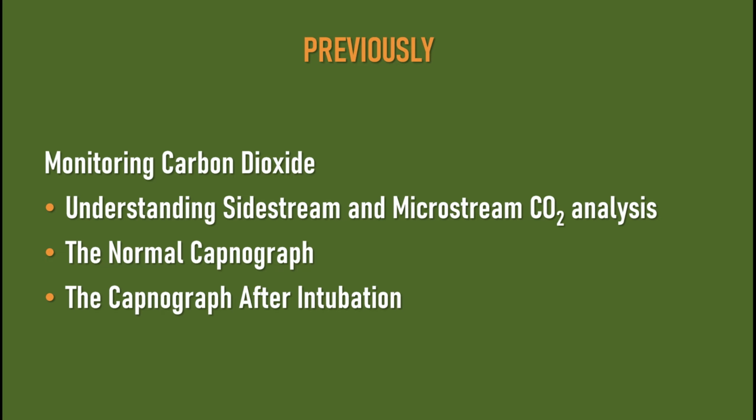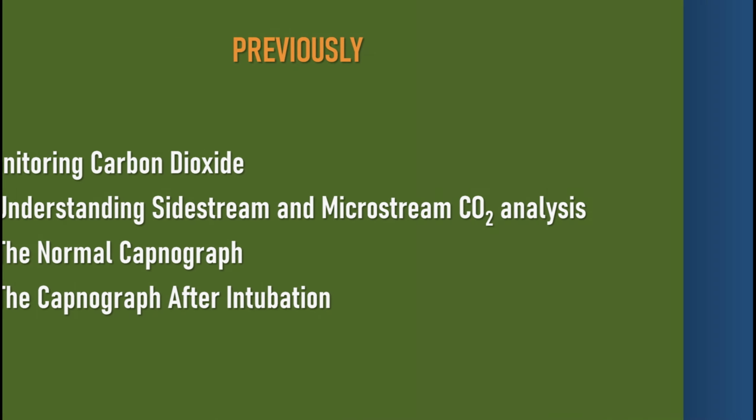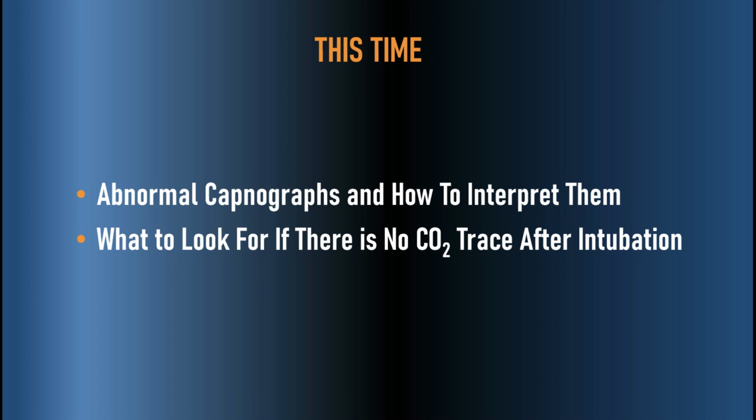But I'm going to advance on this and go through a series of abnormal capnographs that you may encounter in your practice, particularly for anesthesiologists, and how to interpret them. And I'm also going to discuss what to look for if there is no CO2 trace after intubation. Let's start with a scenario.